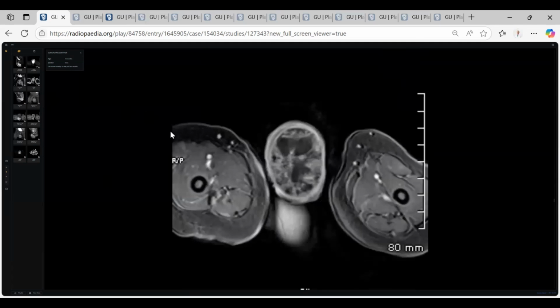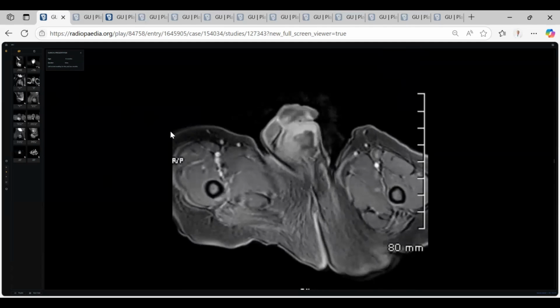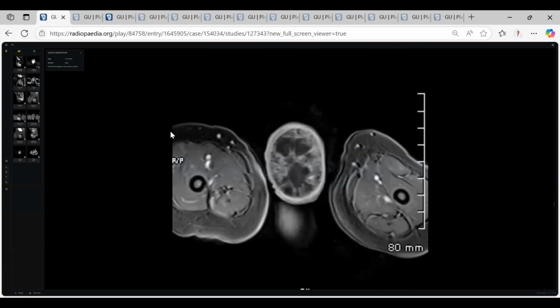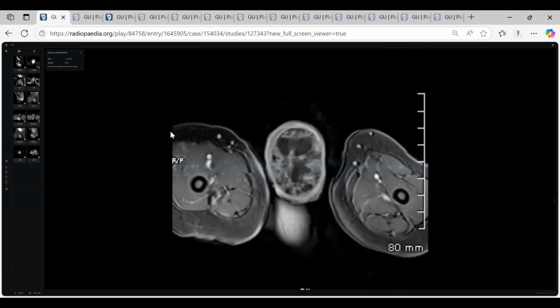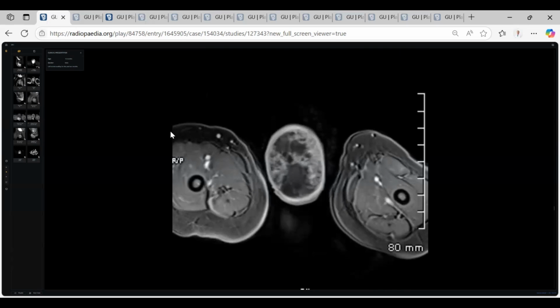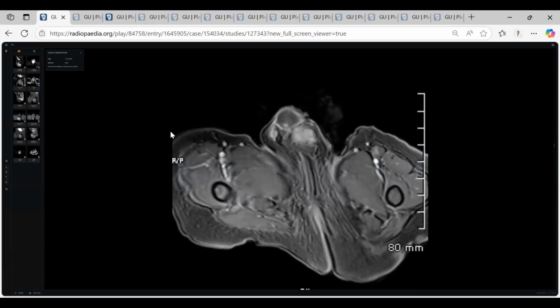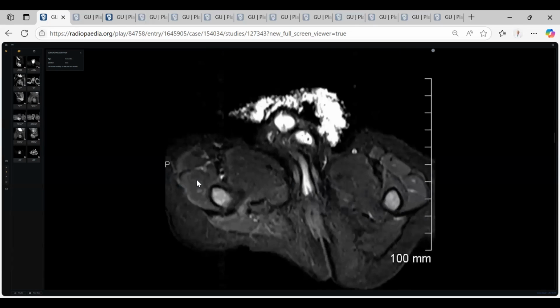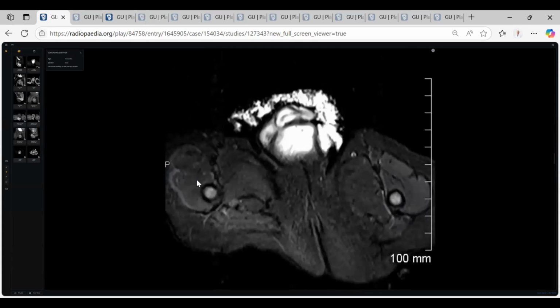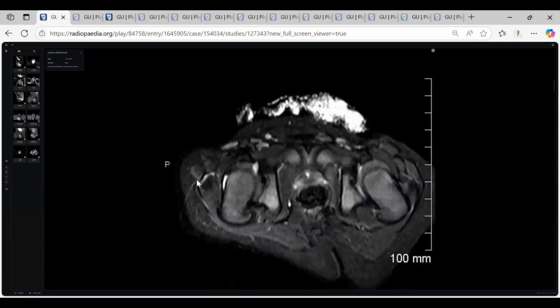And then she goes through the examination. She finds a mass with moderate to marked cystic changes, or you can consider this as a mixed cystic solid mass. Anyway, you can tell the examiner this is at least non-seminomatous, and it does not look like teratoma. So we are dealing with other possibilities like yolk sac tumor and the other list of differential diagnosis. Thank you, doctor, so much.